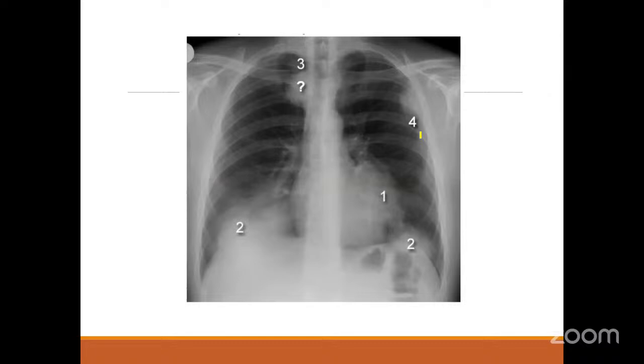There is another sign we could discuss here, called the silhouette sign. Silhouette means having a stark difference between two parts of a lung or a chest which have different penetrance or different properties. As we all know, lung which is filled up with air looks black. Heart, without air, looks white. So this border is usually very clear. But when you have any disease process going on which obliterates this margin, that's when you think that there is some pathology arising there.